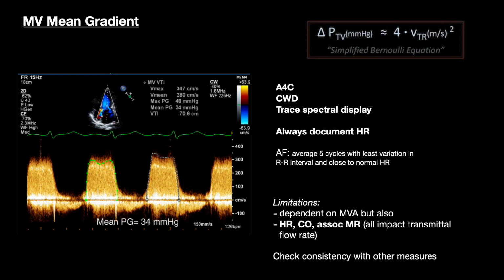Peak gradient is of really no interest here. That depends on peak velocity, which is increased by LA compliance and also diastolic dysfunction.